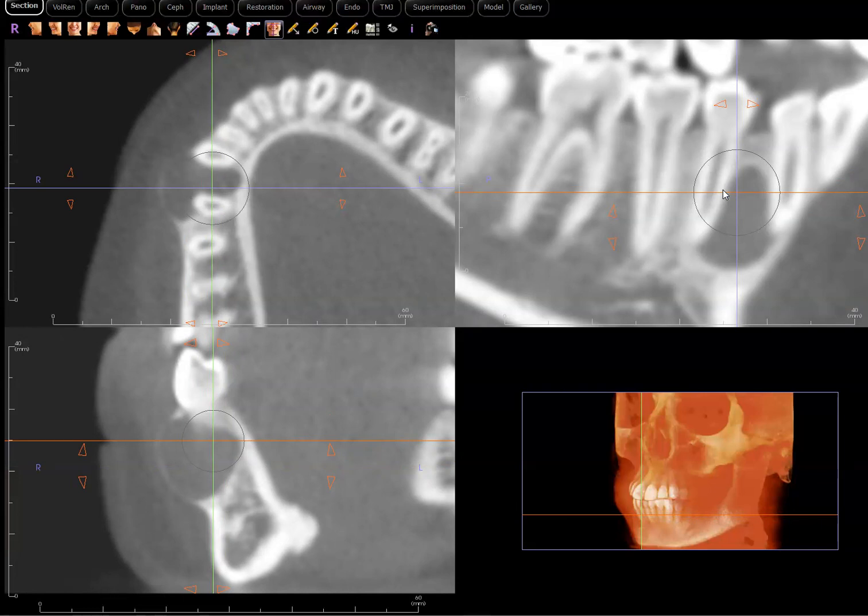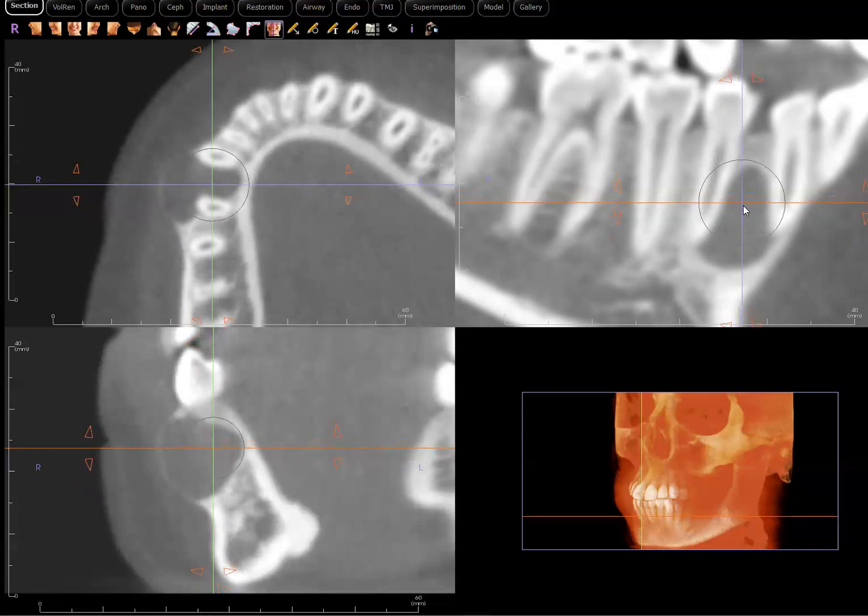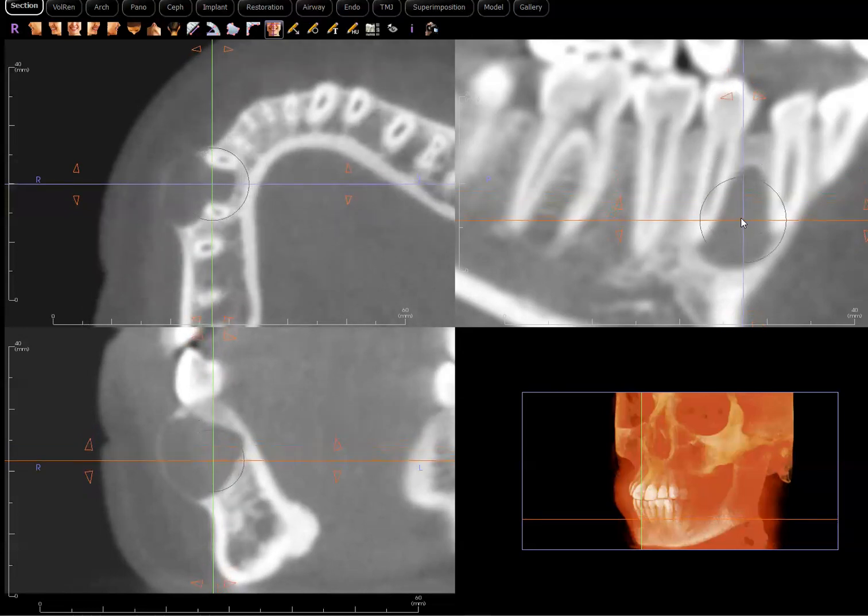But like I said, OKC could be one. There could be, again, a lot of other lesions that could be considered. But this patient being a teenager, and we know that AOT occurs most commonly in young patients, like in teenagers. So this is a good learning case for me to see a non-classic example of AOT. I don't know if I could have come up with that differential, quite honestly, if I only had the CBCT alone. But again, I always learn from looking at these scans, and I never stop learning.